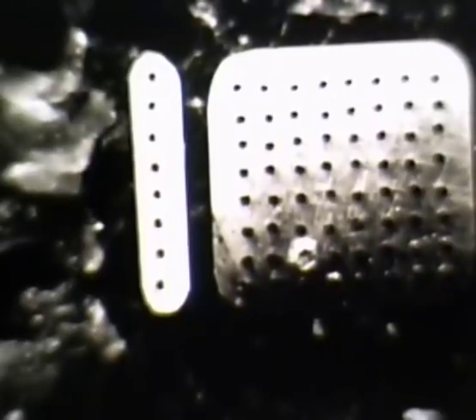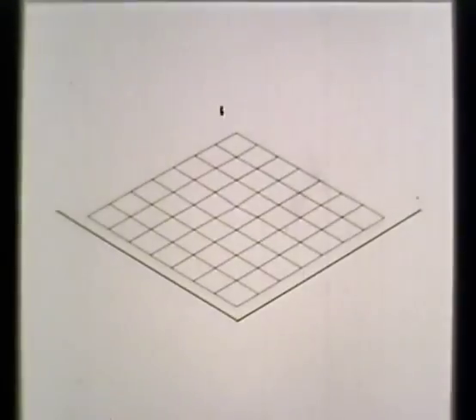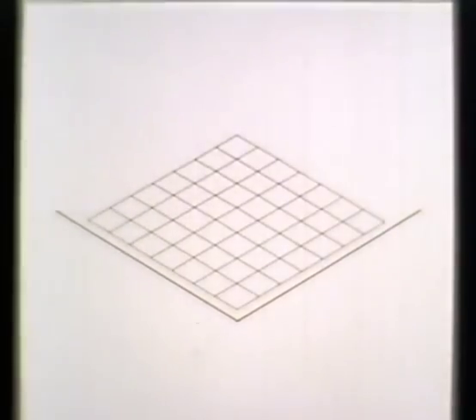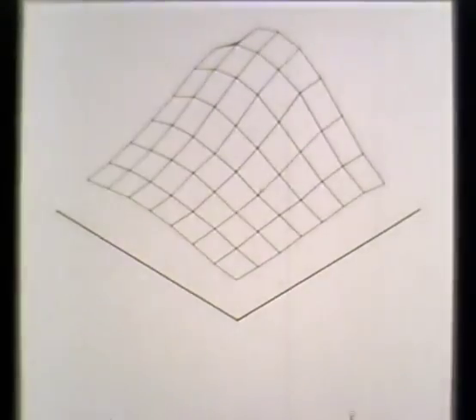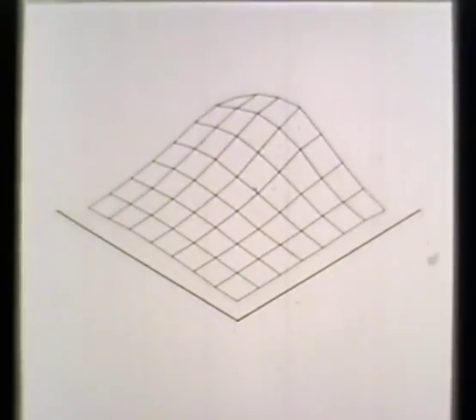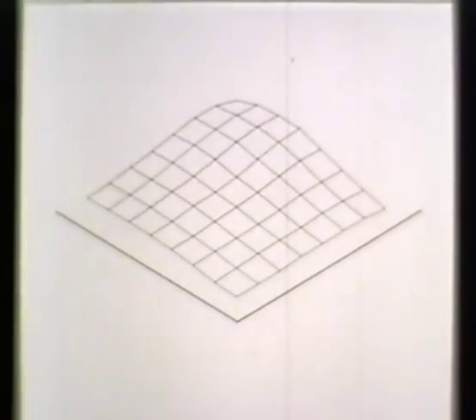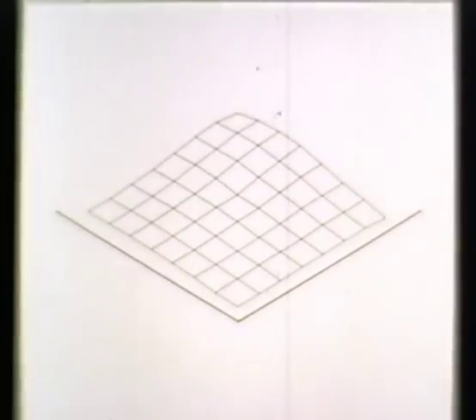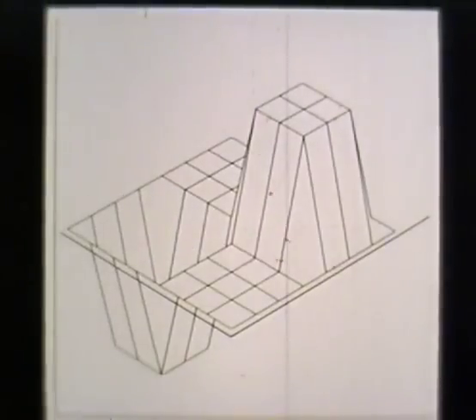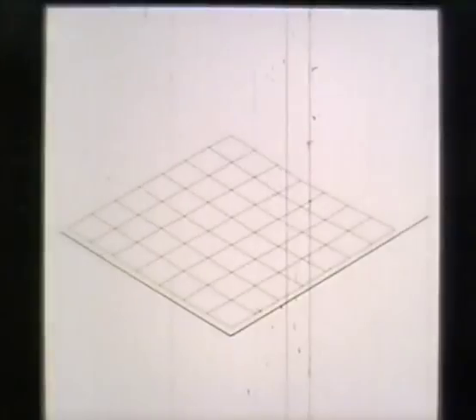The surface distribution is recorded with a 2 by 2 millimeter array, and stimulation is given monopolarly to the olfactory nerve. The direction of propagation is indicated by the arrows. The baseline segment is followed by the shock artifact, the action potential, and the initial peak of the averaged evoked potential. The potential is sampled at each electrode 100 times. 100 graphs of potential are drawn by a computer, and the graphs are photographed on 16 millimeter film by means of animation techniques. The calibration mark is 100 microvolts. The direction of propagation is again indicated by arrows.